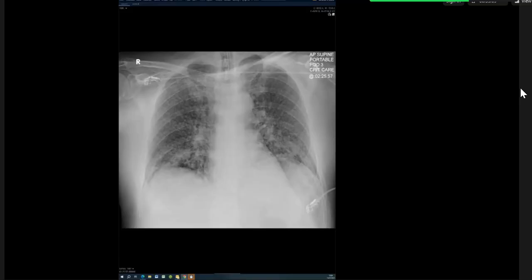So this could be a non-cardiogenic pulmonary edema. Okay. What else can it be? You describe them as nodules. Let's stick with that thought, that they are bilateral nodules. It could be miliary nodules, as in metastasis or due to an infectious cause. Okay. Or fungal infections also could be.